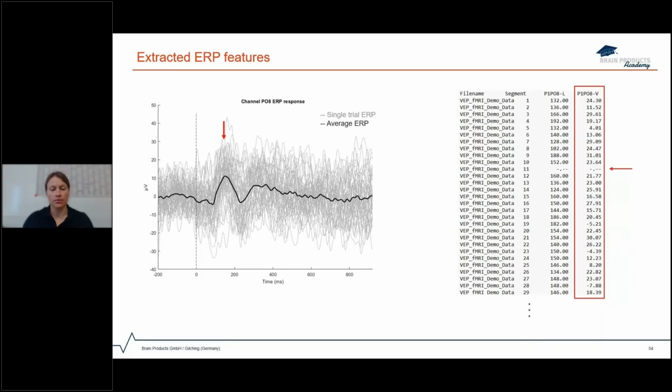So to correctly reflect the trial-by-trial variability in the fMRI data, we should also consider removing these trials from the design matrix in our GLM model. There are other ways to handle missing information, but today I'm going to focus on just removing these trials from my fMRI data set as well.